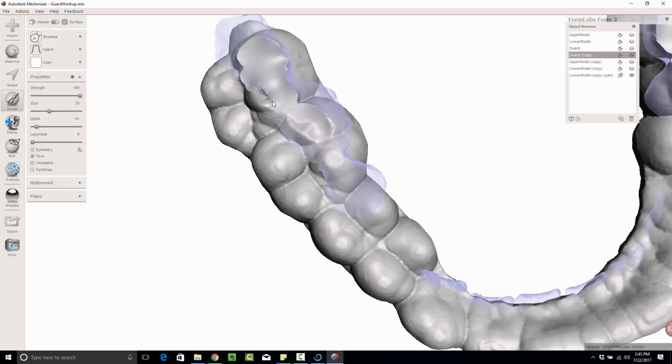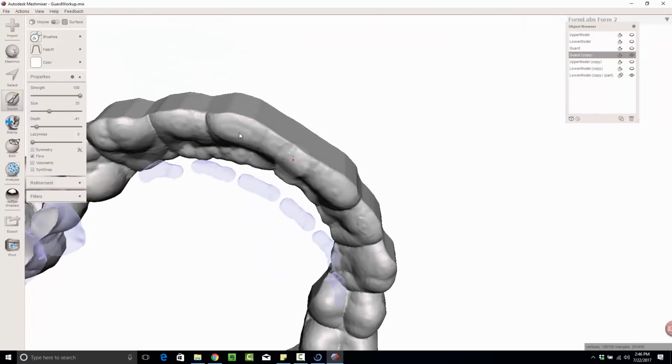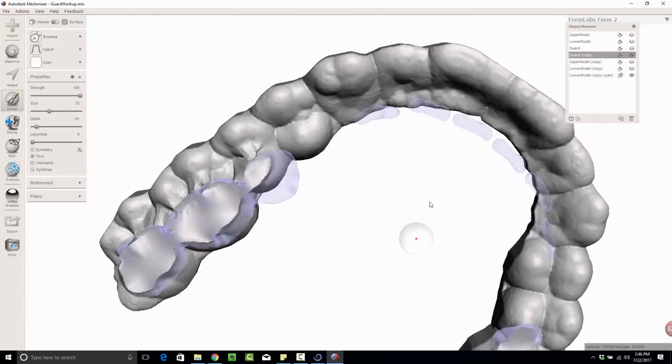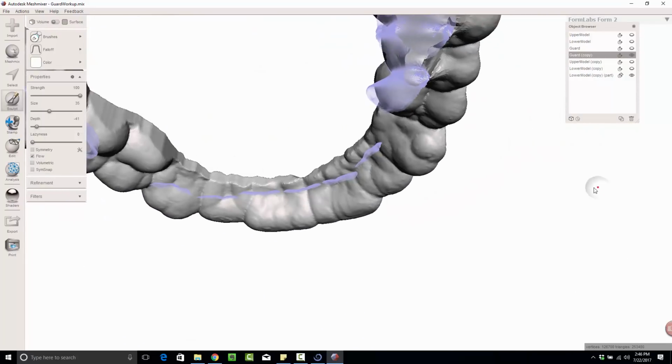Again, we can go pretty quickly with this. And that's why I said this whole process generally doesn't take me a whole lot of time, because generating the initial mesh is about a 2-minute process. Selecting out those areas is maybe 2 minutes, and then this part shouldn't be much longer, 5 minutes on this process. This is where it isn't hard at all, but there is a little bit of a process to this.